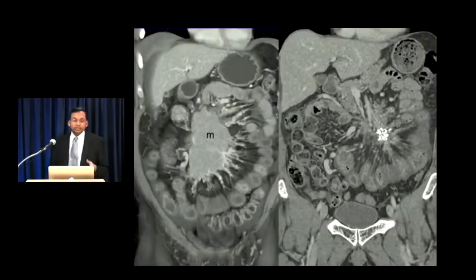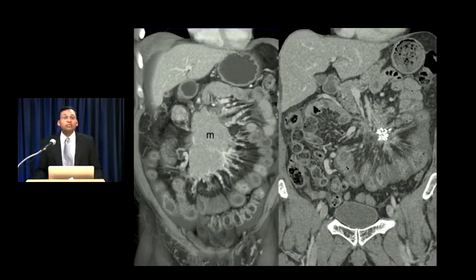Now, briefly, it is worth noting that sometimes you can end up with chronically ischemic bowel as a result of a mass in the mesentery involving either the venous or the arterial vasculature. Typically, these patients have more of a chronic presentation, and this tends to be more chronic venous ischemia. Here's an example on the left of a large mesenteric desmoid, and an example on the right of retractile mesenteritis. In both cases, notice that the bowel is massively thickened, it's edematous, and that's probably on the basis of chronic venous ischemia combined with lymphatic or venous obstruction.